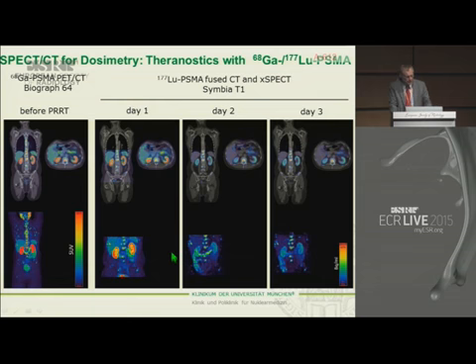So this is another patient. This is, of course, not a glioma patient. This is a patient with a prostate cancer, but it illustrates the principle. So you need to do here, in contrast to radiation therapy with external beam radiation, an assessment of the critical organs, since you do a systemic therapy, so you do not get a too high dose in that case for the kidney.